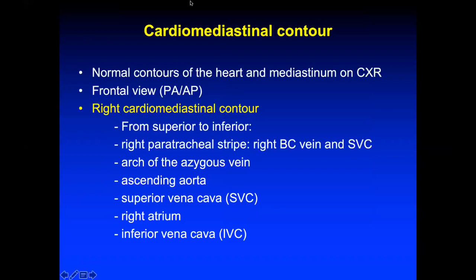In an exam, someone will ask you to describe it. The technical term is cardiomediastinal contour. Never write right cardiac margin or left cardiac margin. Just mention the right cardiomediastinal contour and the left cardiomediastinal contour. So you will have normal contours of the heart and the mediastinum on the chest X-ray.